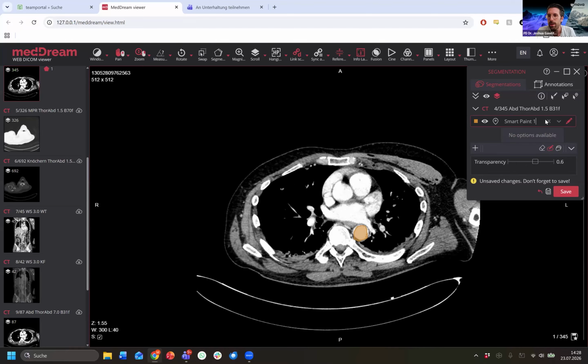But as you can see, really, if you have, for example, a student sitting there that is taking a tumor or something and wants to label it, and you have a study which is not only consisting of one or two small segmentations, but really, really big segmentation work, then this is really, really helpful to just have an overview for yourself, what you are currently doing and what you want to be working with.